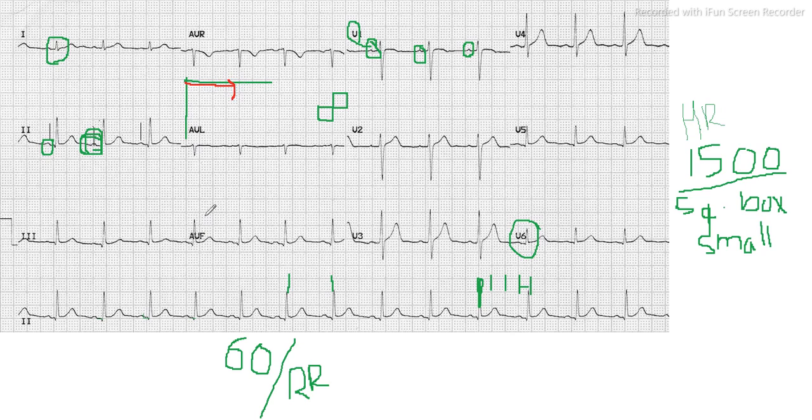And in case of aVF, again there is a positive vector, so you draw the positive deflection vector. Now you draw a perpendicular imaginary line and find the resultant vector. This is the resultant vector here. When you draw it, it is falling between 0 and 90 degrees. So this is an example of normal axis.